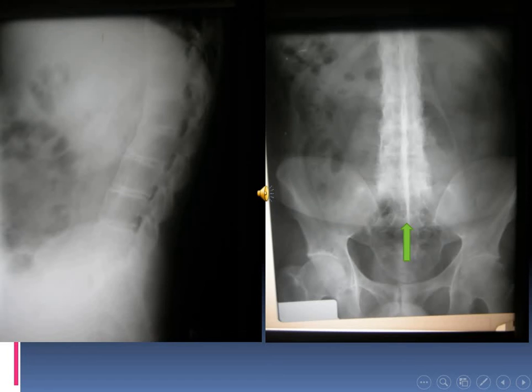About the vertebral changes or spinal column changes of ankylosing spondylitis, we have early and late changes. In fact, in the lateral X-ray of the lumbosacral spine, we can see abnormal shape of vertebra, which is more towards the square shape. Normally, it should be rectangular, and there is a good amount of space in between the vertebra, while here we can notice that the shape of the vertebra is more toward the square shape, and this gives an impression of narrowing in the intervertebral disc spaces.